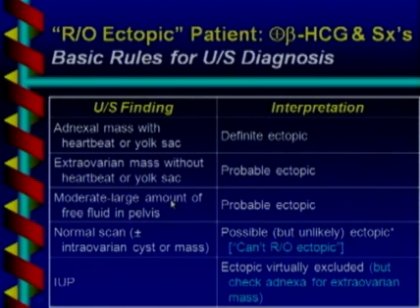If there's a moderate to large amount of free fluid in the pelvis, we also have a probable ectopic in this patient, again, that has positive pregnancy tests and symptoms.